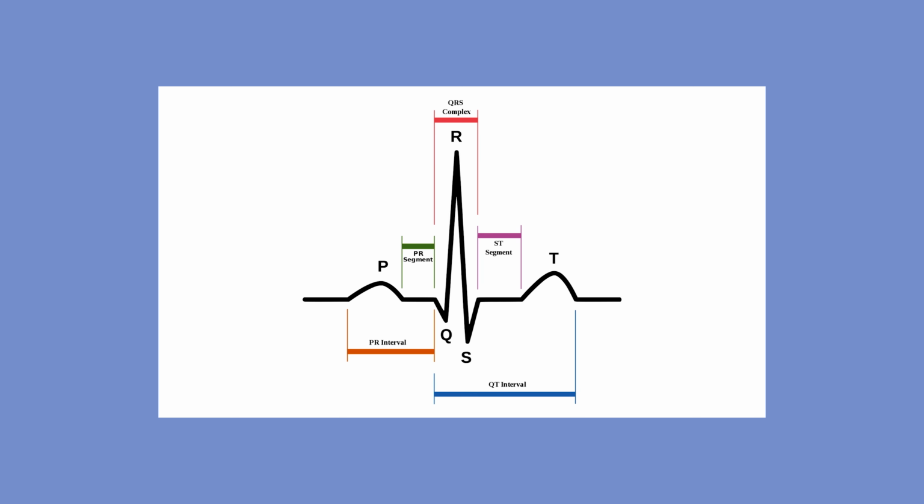Okay, cool. So a P wave represents atrial contraction, so that's when the top contracts. As we said, it's the two together. Then we've got the QRS, so that's the Q, the R, and the S, and that represents ventricular depolarization, so when the ventricles contract. And then the T wave here represents when the ventricles relax.